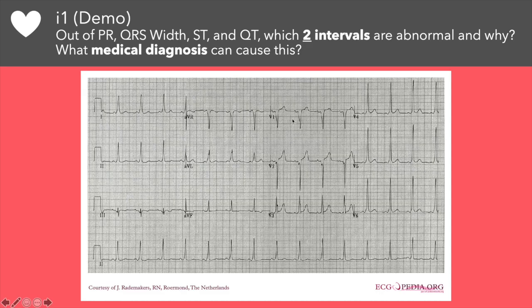It does look like, in V1 and V2, a bit of an ST elevation, but it does look concave up, and I don't appreciate any reciprocal changes, so hopefully it's less likely ischemic. Also, the elevation is only about 1 millimeter from the baseline, which is TP. If the patient is female, the cutoff is at least 1.5 millimeters for V2 and V3, and if male, the cutoff is at least 2 millimeters for age 40 and up, and at least 2.5 millimeters for age less than 40. When looking at the QT, it looks less than 1/2 the RR interval.